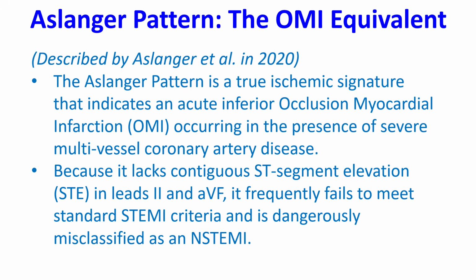The Aslanger pattern is a true ischemic signature that indicates an acute inferior occlusion myocardial infarction occurring in the presence of severe multivessel coronary artery disease. Because it lacks contiguous ST segment elevation in leads 2 and AVF, it frequently fails to meet the standard STEMI criteria and is dangerously misclassified as an NSTEMI.